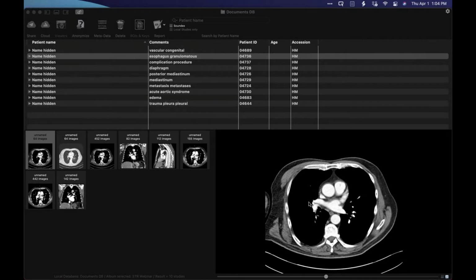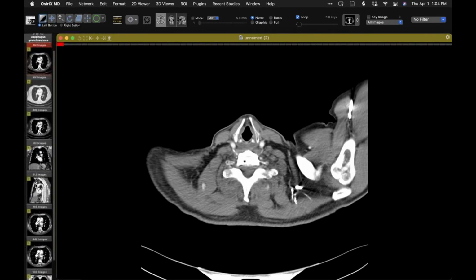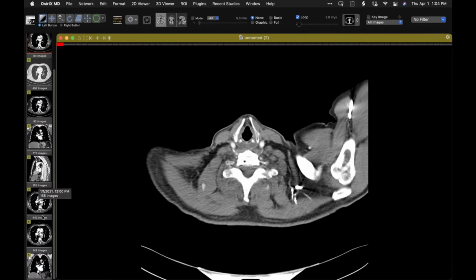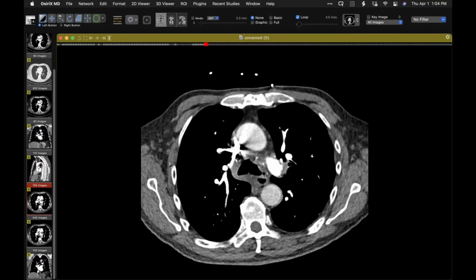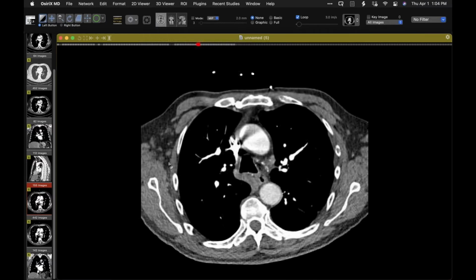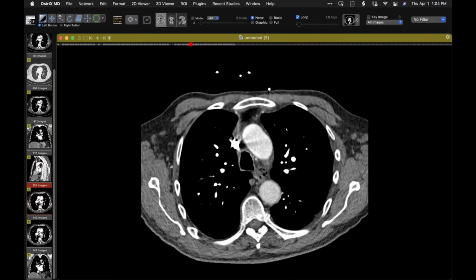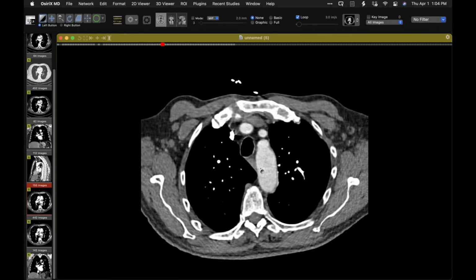All right, I'll show the first case, which is a nice finding that one of my residents made. Let me first show you the more recent CT that he saw. Let me make sure I've got the right sequence. So it's right here. So here is the esophagus.